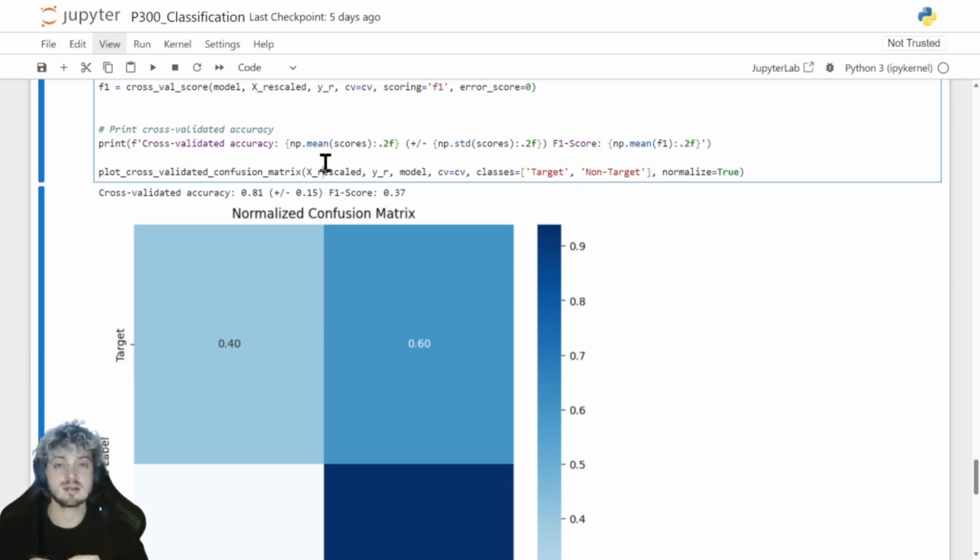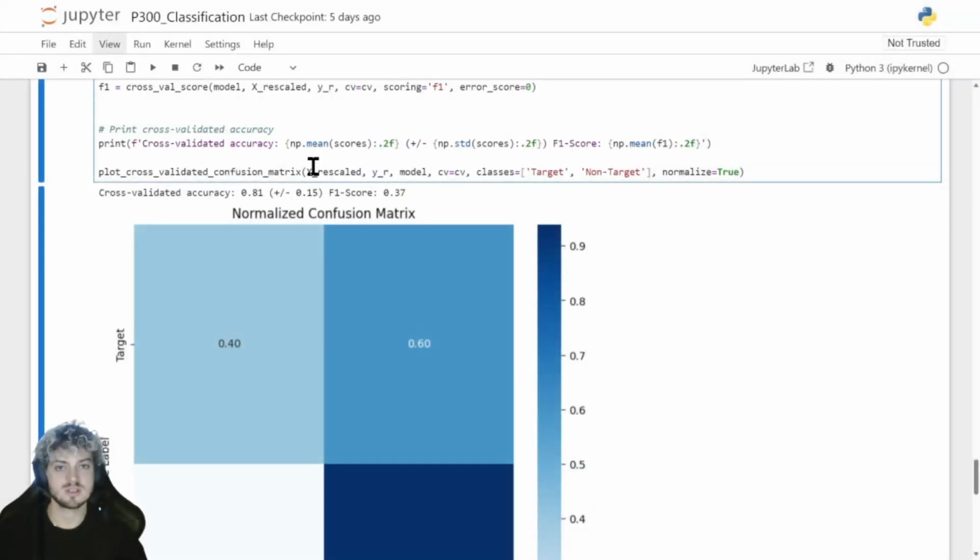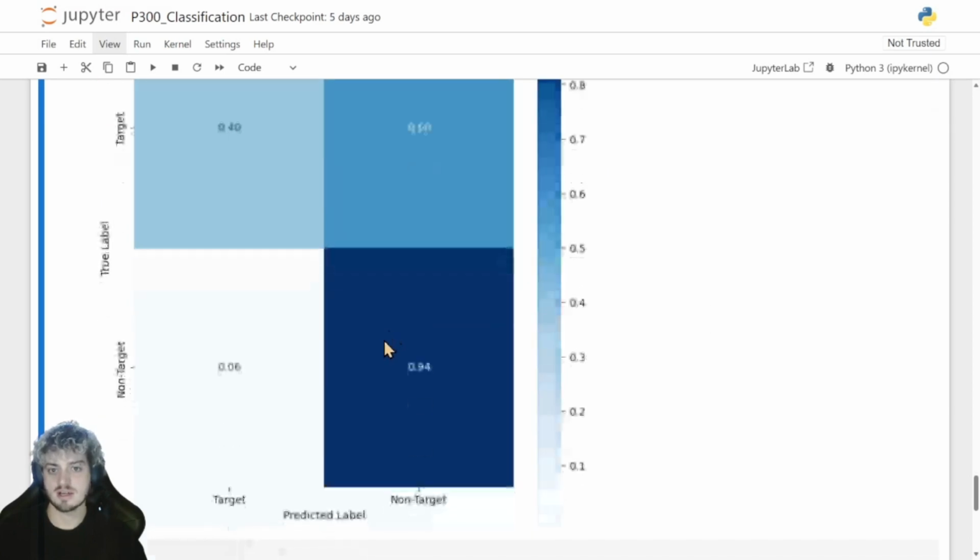So meaning that the application is not reliable. There might be moments in which it's very precise and moments in which it's almost closer to random. So here we go even lower than 70% in the worst case, right? So the variance is pretty high.